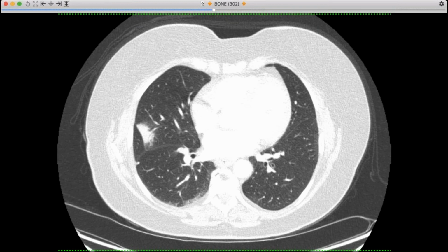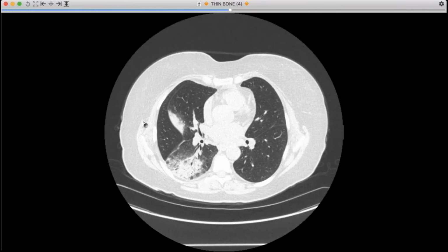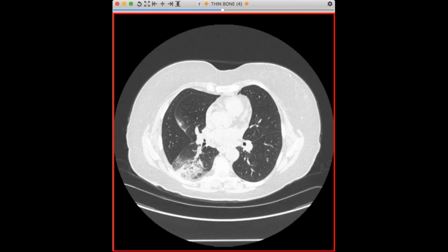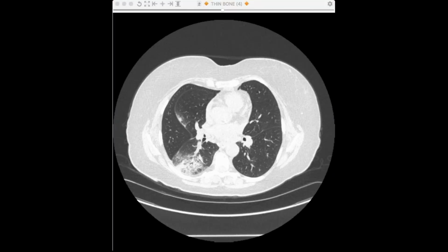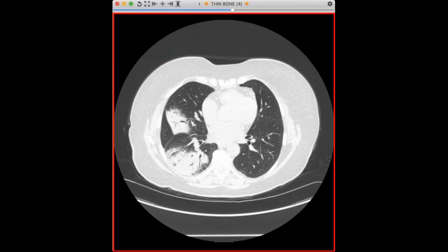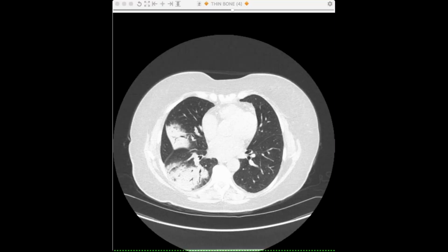The patient was started on high-dose steroids. And so that was the initial, one of the scans where it was the most compelling. This was about 2.5, 3 weeks later. I'm just going to put them up side by side here. And what you can see with the steroids, this dense area of consolidation. Only seeing one. Oh yeah, I've got to trick it. I don't know how to make it show both. I don't know how to do that with this version.